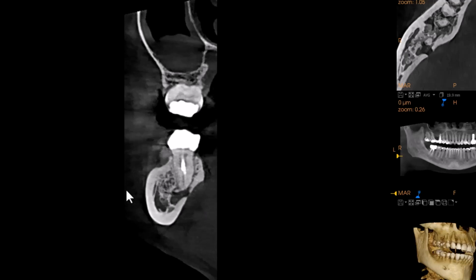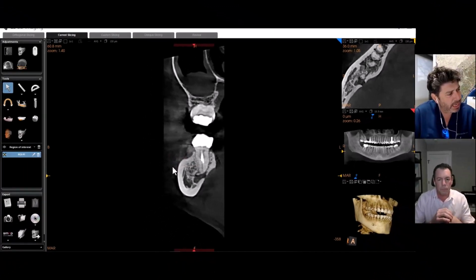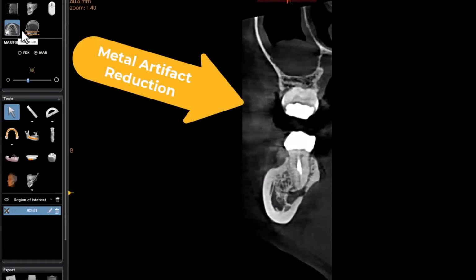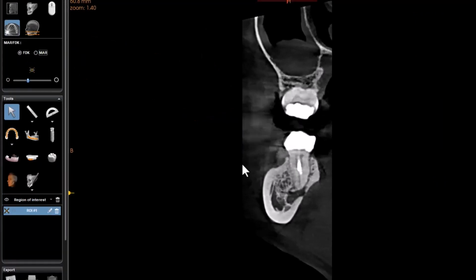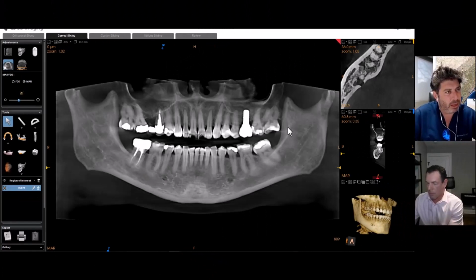But as you can imagine, if you're taking a two-dimensional periapical film, you're shooting an X-ray through this dense cortical bone, all of this bone within the actual cortices, and you don't really appreciate the significance of what you're dealing with here. This is really demonstrative of why cone beam CT should, in my opinion, be standard of care for dental imaging.